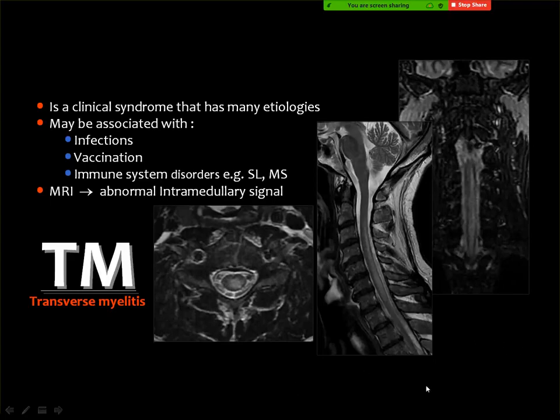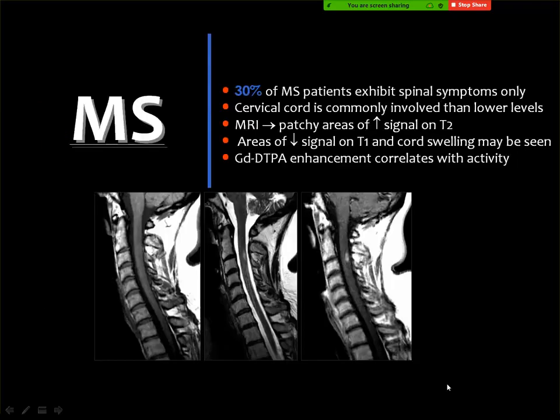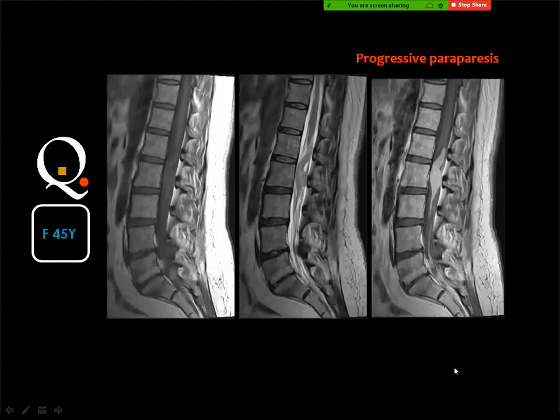The diagnosis may be reached upon having the clinical history. Then, if you look here, this is the focal lesion, which is not appreciated in the T1, but seen in the T2, and it enhances. This localized lesion can fit very well for the possibility of an active MS plaque, which is one of the differential diagnoses of transverse myelitis.